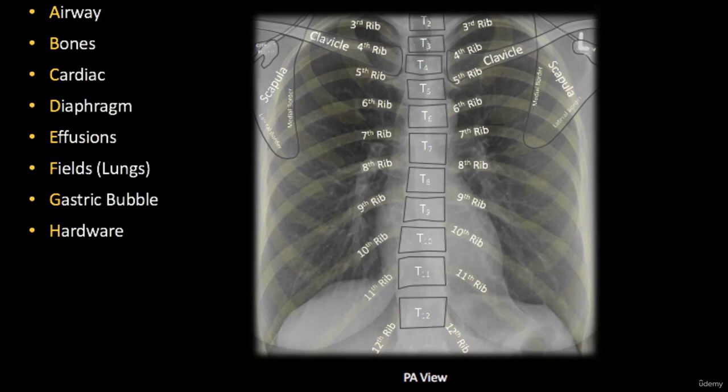And from here we can calculate the other T vertebrae, T3 and T2 above this level and T6, 7, 8 below this level. The X-ray is the most time-effective method which allows us to identify fracture and dislocation quickly. So we can look at the ribs here, the clavicle, scapula, and check how intact they are.